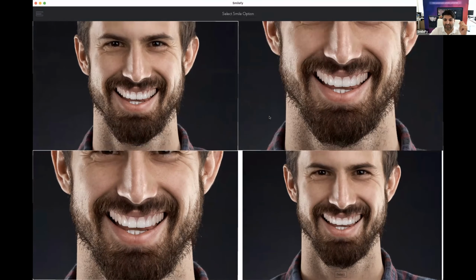Let's go to the colors, just readjust a little bit the brightness of the posteriors. And our patient is motivated. Our patient wants to know more about the aesthetic treatment. Here we go. We have the slider and we have the side-by-side picture, right? This discussion took me 3 minutes. And that's the most important thing.